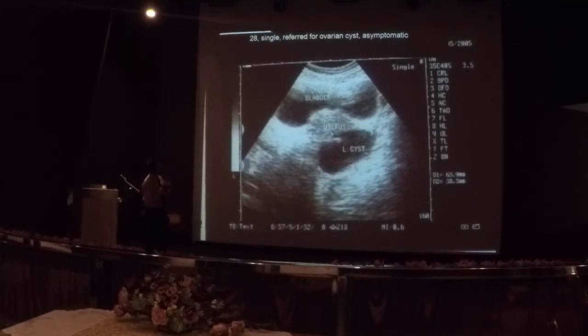She's asymptomatic, 28-year-old. Then nampak apa kat dia? If you are in district ke, if you are in the pusat kesihatan ke, kalau saya main kat saya pun saya suruh observe dulu. Scan balik 3 bulan, kita scan balik tengok, kan? If the cyst persists, then barulah kita diagnose persistent ovarian cyst, then you can advise her for surgical intervention. So if it disappears, then the diagnosis would be functional ovarian cyst. So no need for any form of surgical intervention.